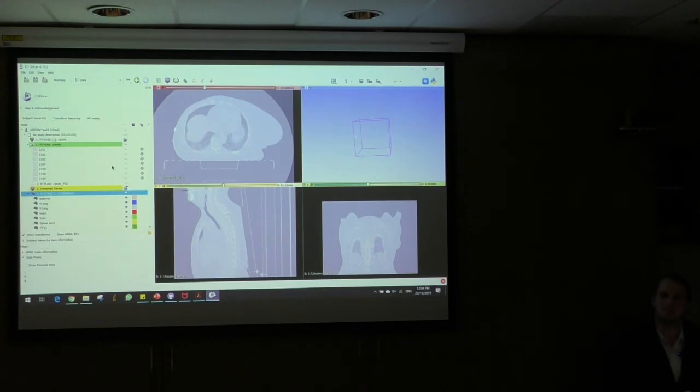So I'm not sure if I'm doing something wrong. Oh, if you merge those two, merge and build, then it should create a color of just the solid structure of those two. Yeah. Those two models, yes. And then you can export that, and I'll go into that very shortly, into your STL file, yes. So you could make just a singular print, yeah.